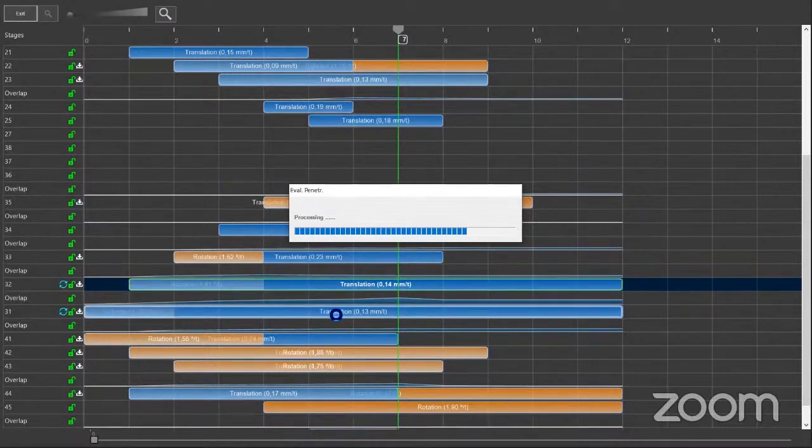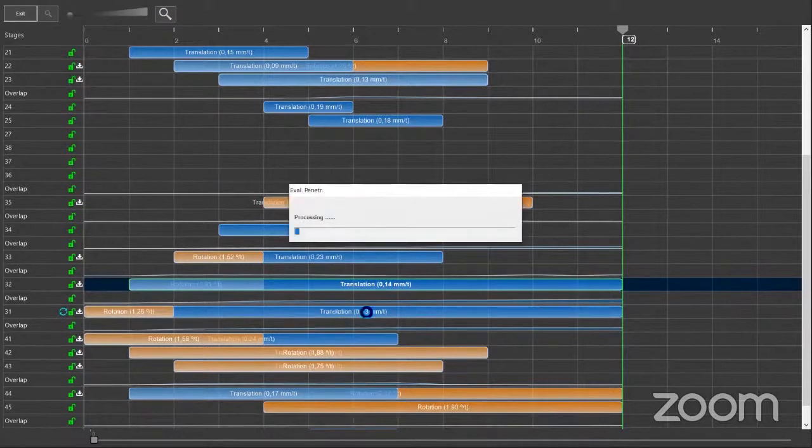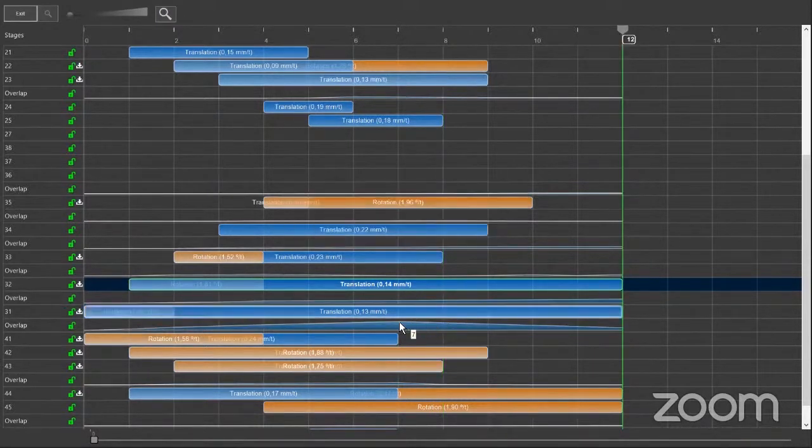So mathematically here, you can try. I don't know the biomechanics. You see how much it was reduced? With the information of the biomechanics of the movements of the teeth with the aligners, you can see how to do it without actually extending our treatment. We're up to 12 aligners, and we try to keep it that way, but trying to make it as comfortable as possible for the patient. If we cannot, by the sequencing or the velocity change, you see, now what I did was push it to the other side.